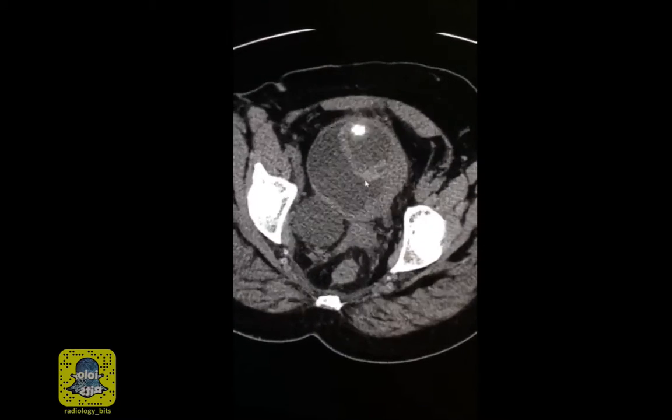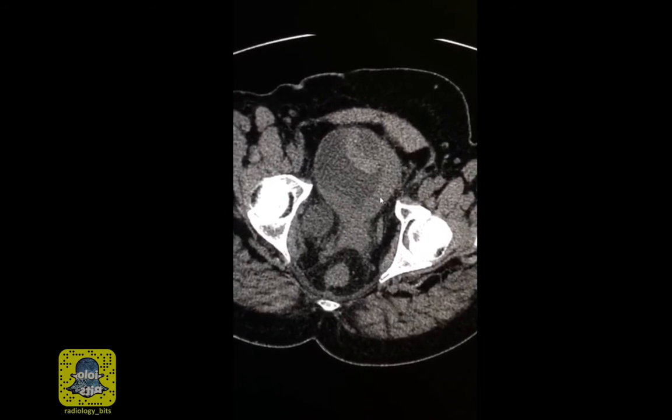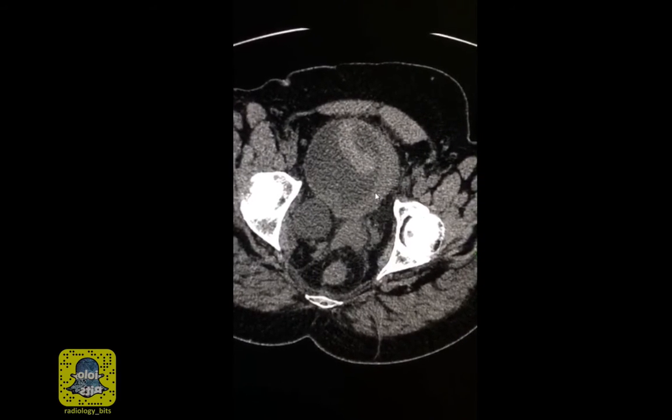From a practical point of view, when you see this lesion, cystoscopy and tissue sampling is recommended, but always make sure you don't have multiplicity with TCC.